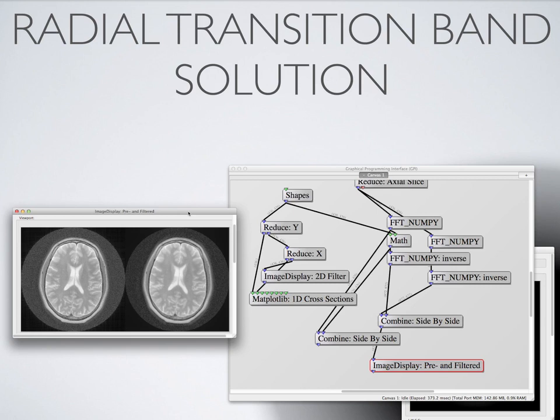Well, we've looked at a few nodes and some potential ways of using them. This example provides a simple and yet commonly used algorithm in MR reconstruction.